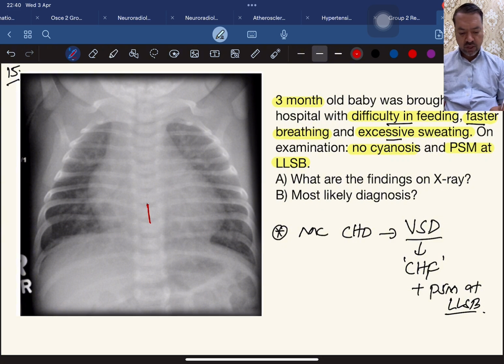So of course, see here, the farthest point from the midline, you note it, and here is the farthest point on the other side. Let's say this is A and this is B. When I add A and B, it becomes C. C means cardiac diameter.